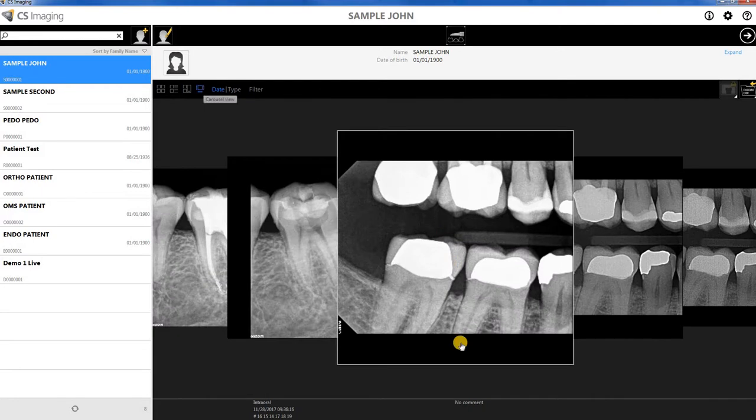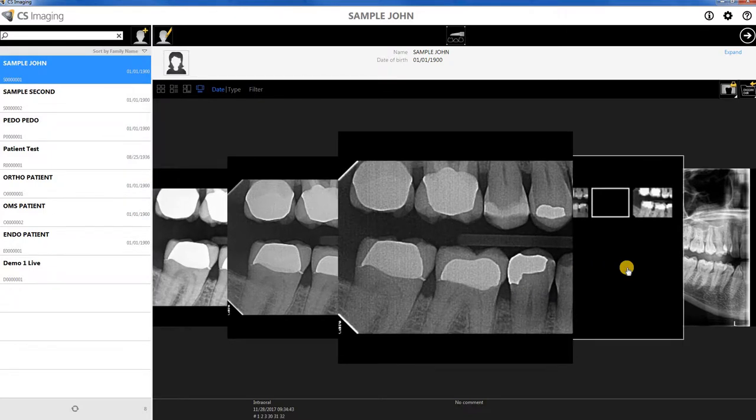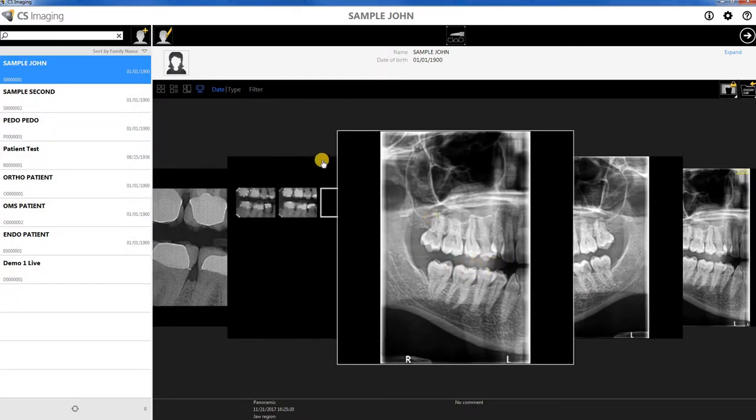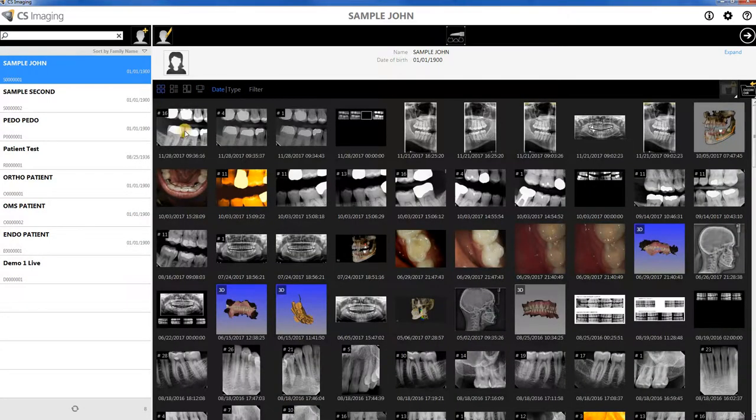But we also have this gallery, which is kind of neat as well, which allows us to go through and view each of the images here in a gallery. And these are blown up from the thumbnail images as well. So it'll allow us to get a better view of the images, but it's not going to be perfect quality. So I like to keep it here as the thumbnails.